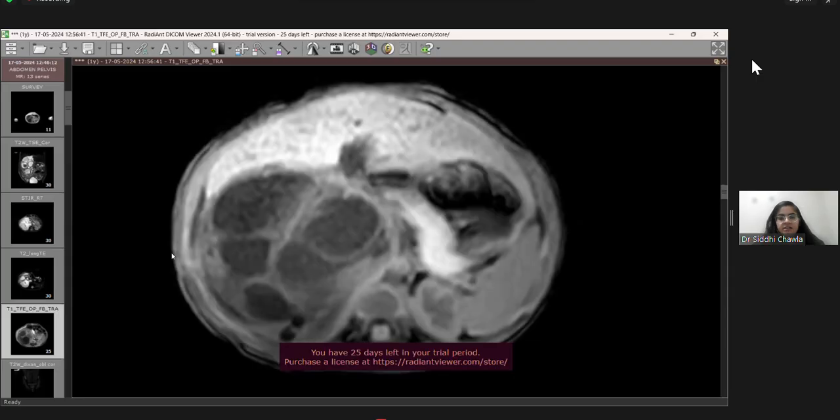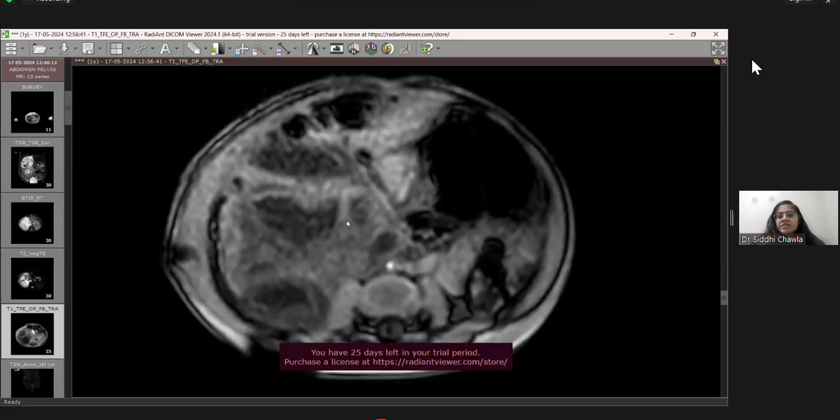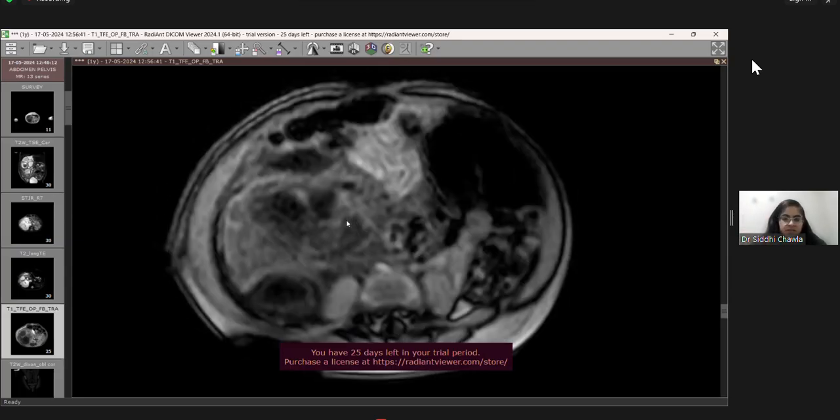We can again see that most of the cysts appear hypointense, except a few cysts that appear hyperintense. There was also confusion in this case whether this was post-procedural or existed from before, because the patient had some bleed also. So my advice is always not to intervene in cystic lesions before you know the diagnosis. Eventually, when the Foley's was taken out and the sample was taken, it came out to be mucin, and the patient was eventually treated like a mesenchymal hamartoma.